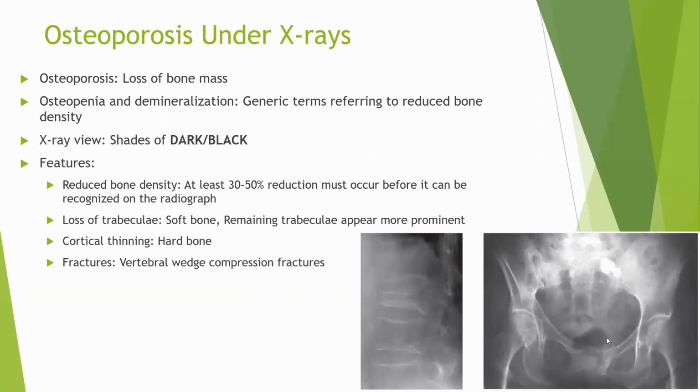This side is left and this side is right, as when you are reading it, because of the patient's PA view. So this is the left side of the pelvis, and there is a fracture to it on the left side. Also look at the impaction of the femoral head of the right side within the acetabular cavity.